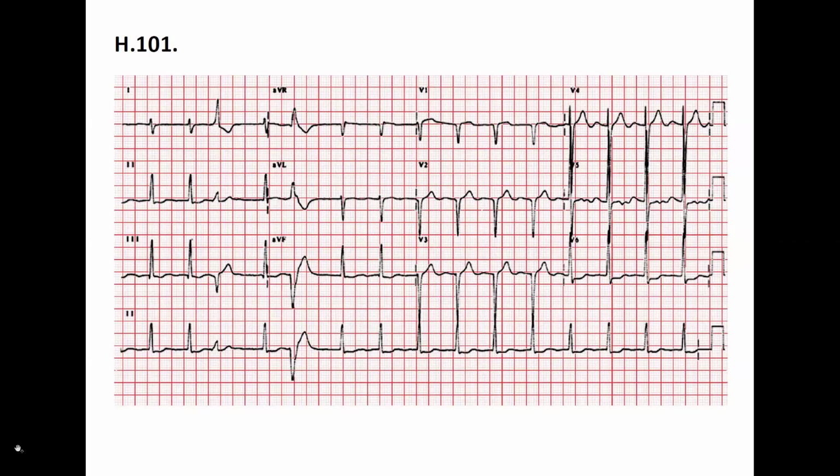However, you do see a part that makes it arrhythmic. Yes, can you point to this one? What could that be? Why is it arrhythmic? I'm so sorry, I don't know right now. Well, so you haven't studied enough.